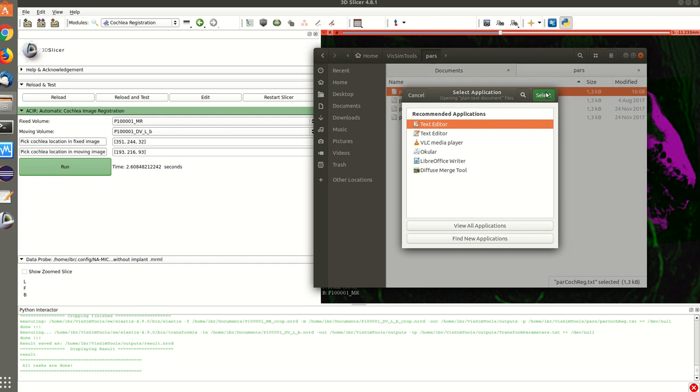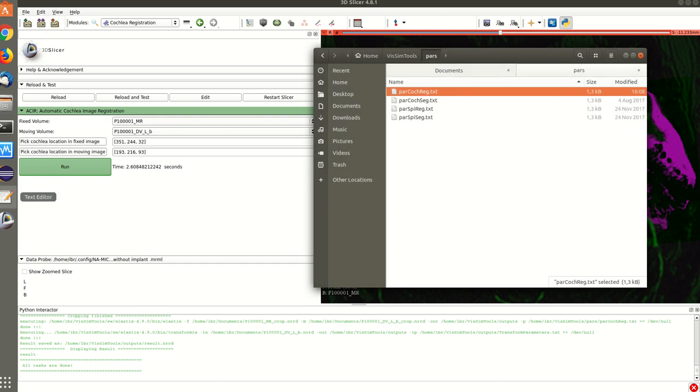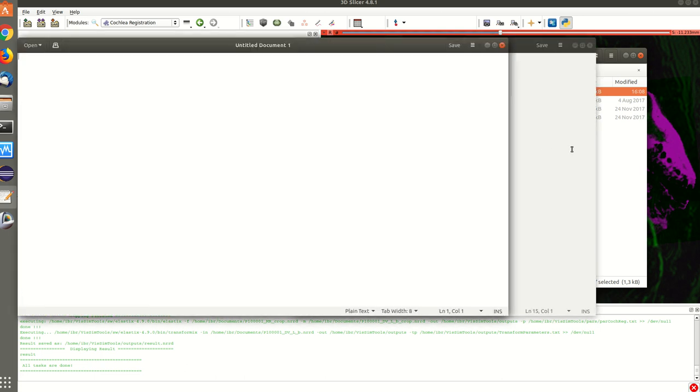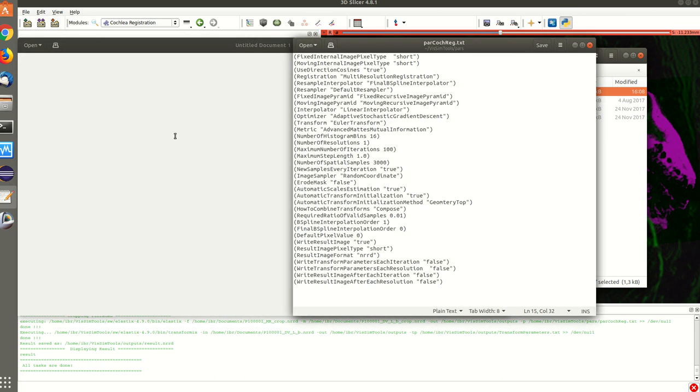Actually, I already opened it, so it is already here.